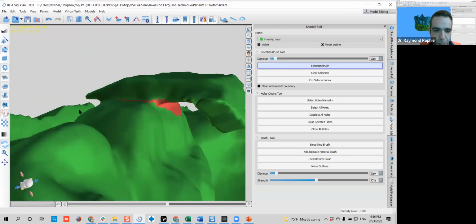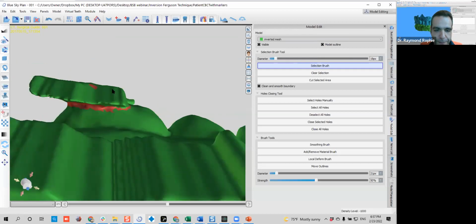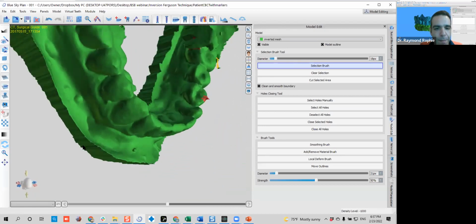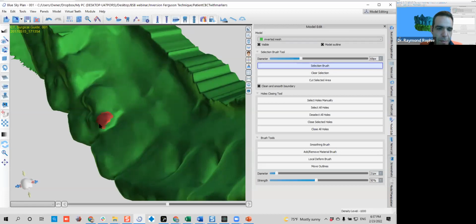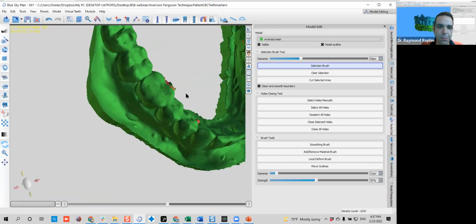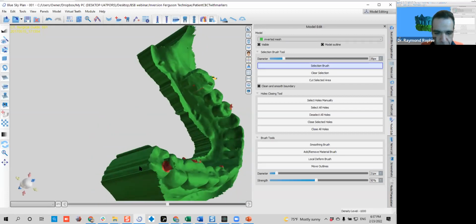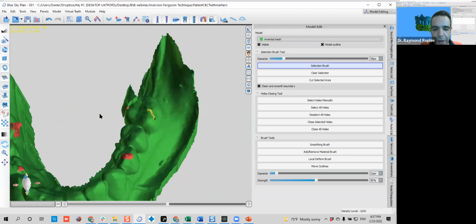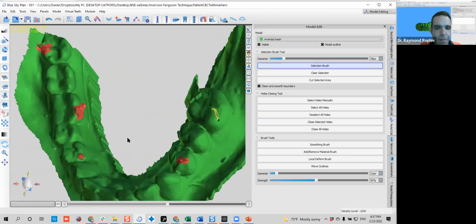As you can see, it's important that you always get comfortable viewing so you can make this efficient. Okay, good. Now with that selected, let's go for more. Here. Okay, and there's another one right here. Good. So yeah, why not? We're on this. We're doing this, so let me just clean this as well. Okay, is this extremely important? No, this is not important. The only important area that I really care about is just beside my implant. Since I'm showing the functionality, I want to do it, and also because I like it.